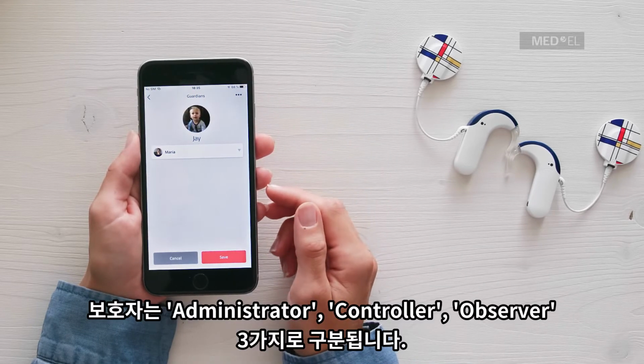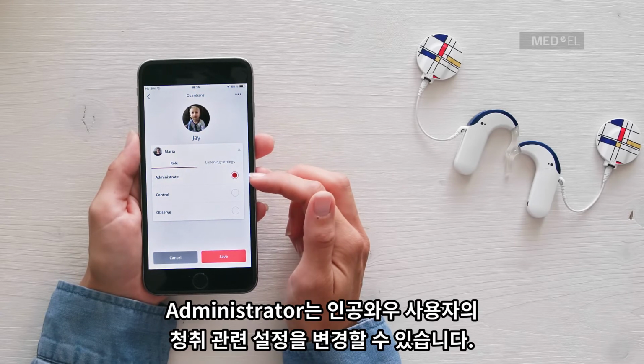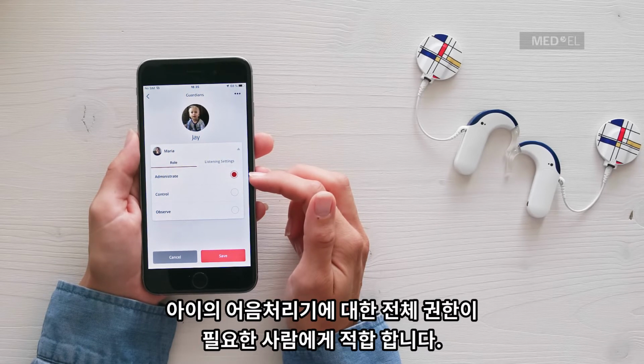There are 3 different types of guardian role. With the Administrate Guardian role, you can change the user's listening settings, view their hearing stats, and decide which roles the other guardians have. This is the ideal role if you're a parent or caregiver and need full access to your child's audio processor setup.